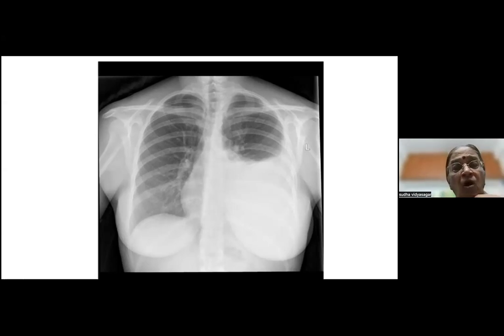Now, those of you who called it a hydropneumothorax, that line would have been one straight line. The water in the bottle that you fill, if it's a half-filled bottle, it doesn't curve up any side of the bottle. It just gives a straight cut. And you should have seen the edge of the collapsed lung if it's a hydropneumothorax of this size. And you can see the bronchovascular markings here. So it's not a collapsed lung.